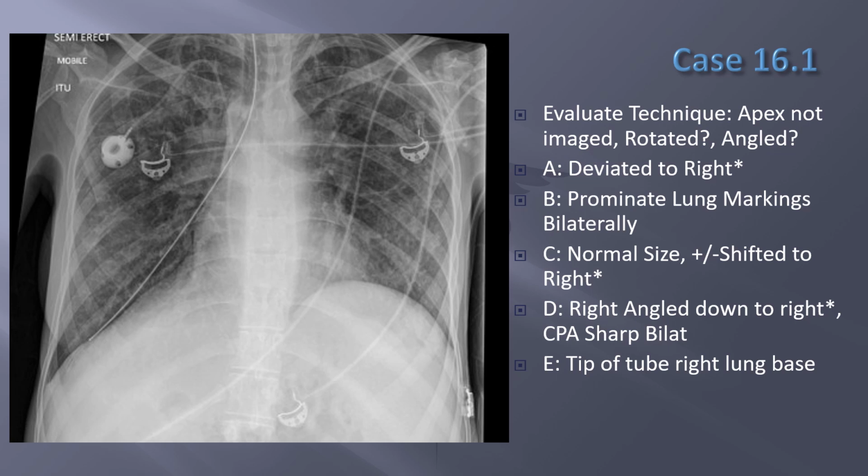Breathing fields, again, kind of hazy throughout. Cardiac silhouette, kind of normal size. Diaphragms, this one seems kind of sloped down. This one's kind of domed. D, everything else. Ribs seem to be okay. Got a med port here like we've seen before.